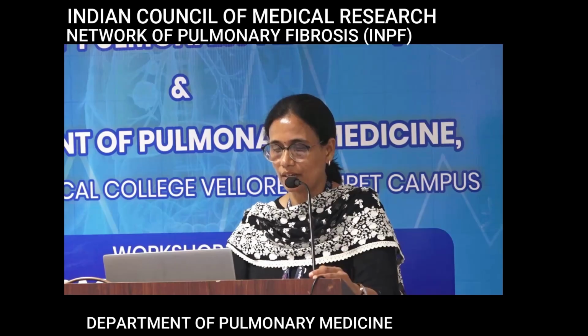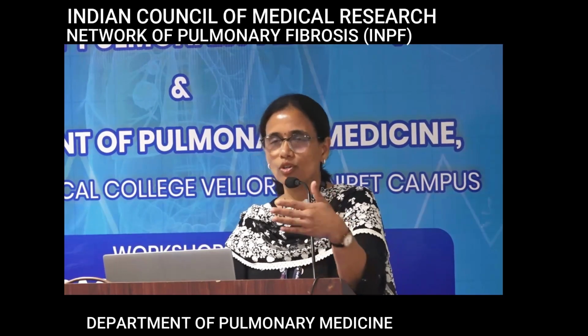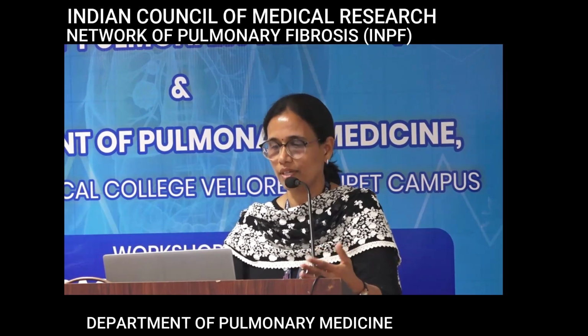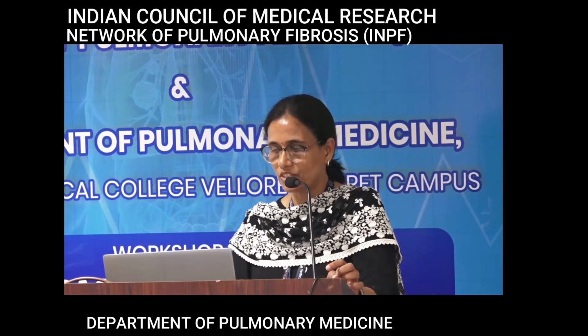So this is a very typical appearance of a fibrotic hypersensitivity pneumonitis. I'm sure you'll go through all these, you have sessions for everything. Basically, again, this has been classified as typical, compatible, indeterminate, etc. for fibrotic HP.